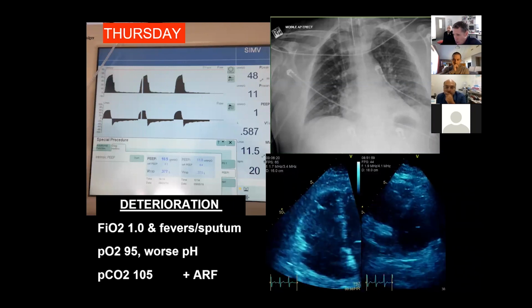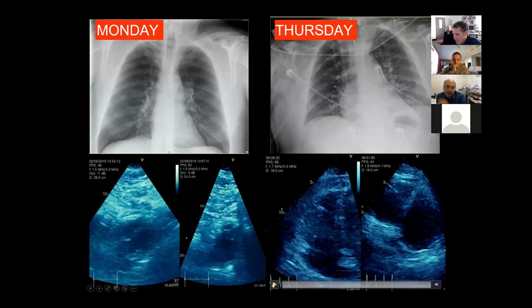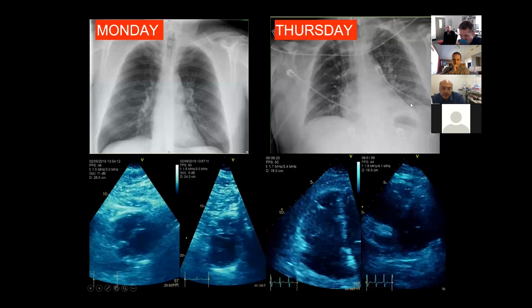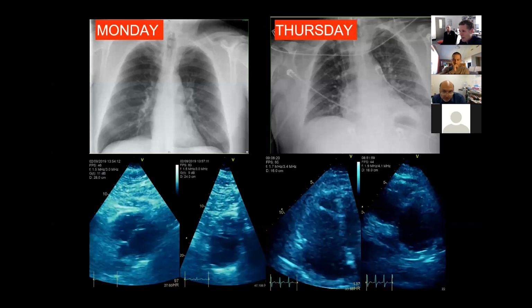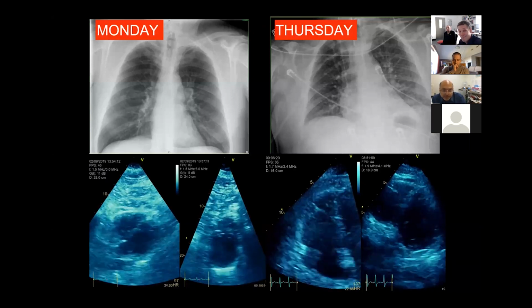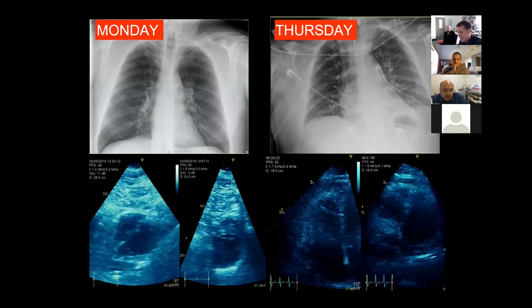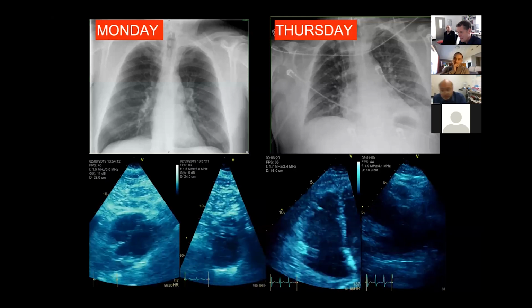I think I might be able to actually show them next door to each other here. So that's a good comparison, I guess. Try that. And on the right side, where I guess it is the apical 4-chamber or subcostal, I'm not sure, but whatever the view is, the right ventricle is very much dilated as compared to the previous one. Definitely the longitudinal contractility is much worse onto the left side, onto the right side.